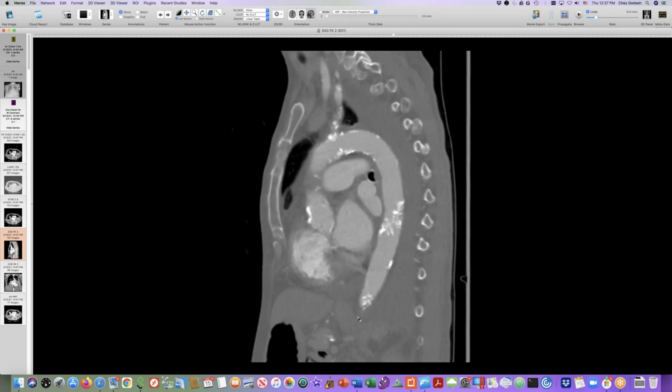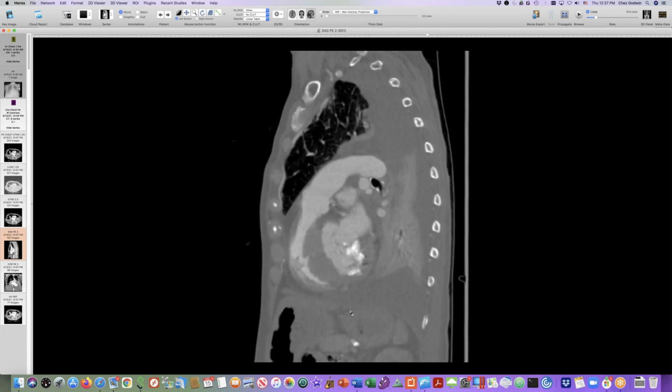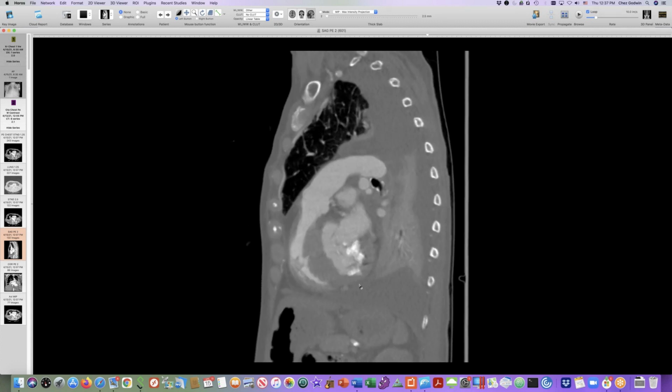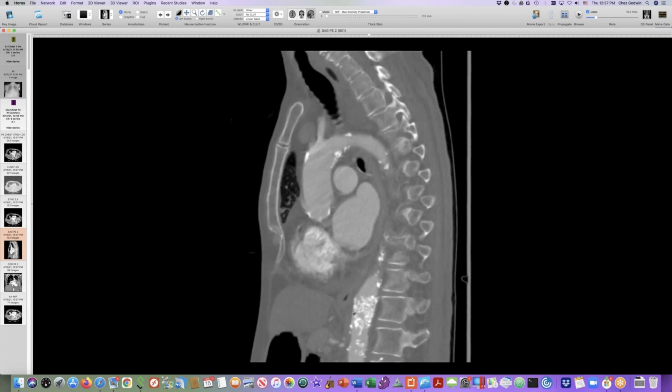So that was one suggestion yesterday, and that makes sense. It looks as if it's got a discrete lower edge, irregular upper edge, and maybe it fractured, and this is a different component that originally was part of a bigger stent that sat here. But why would it have gone retrograde like this in the aorta if it was really for iliobifemoral disease and stuff like that? And you should put the metal in there too.